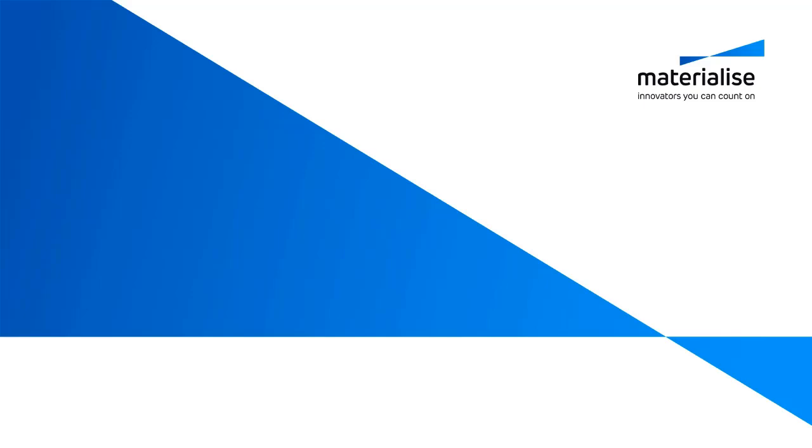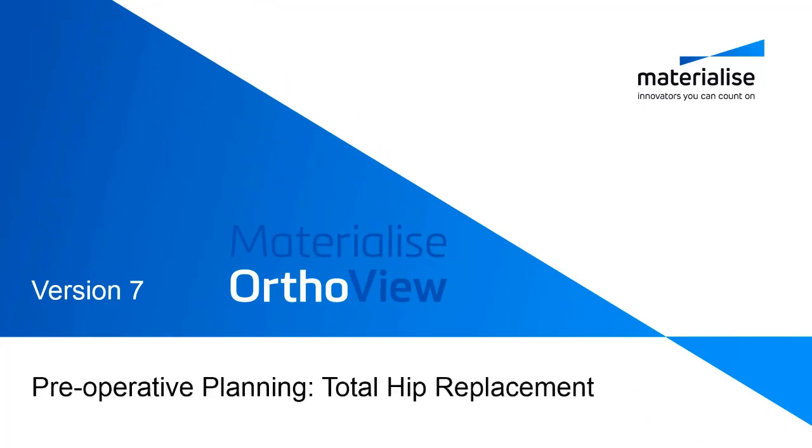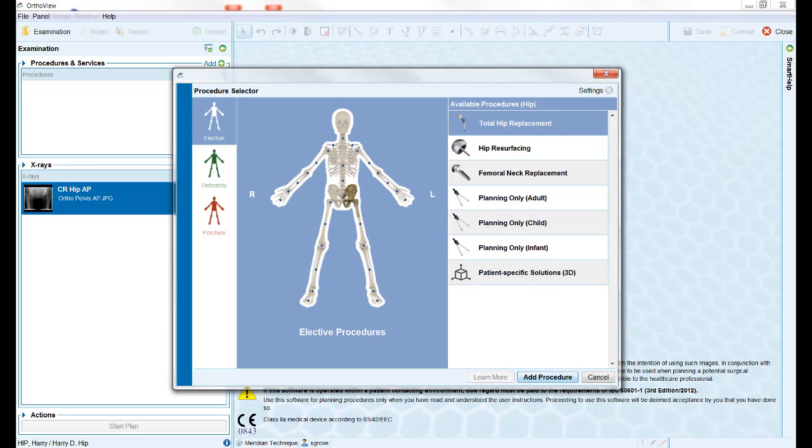This short training video will take you through the steps of planning a total hip replacement in Materialise OrthoView. Having opened the patient's study, the first step is to select the required procedure for the patient. In this case, we are planning a total hip on the patient's left side.